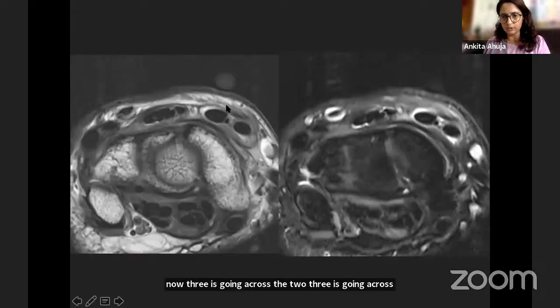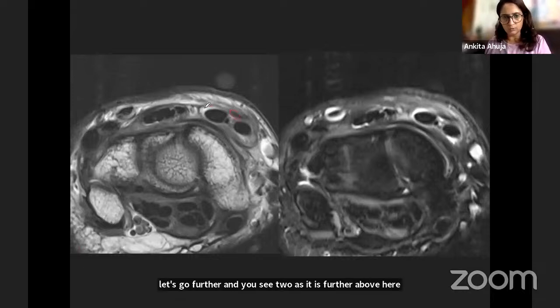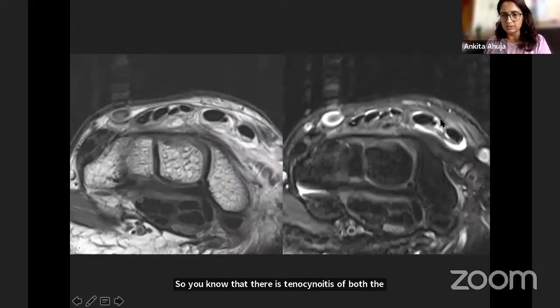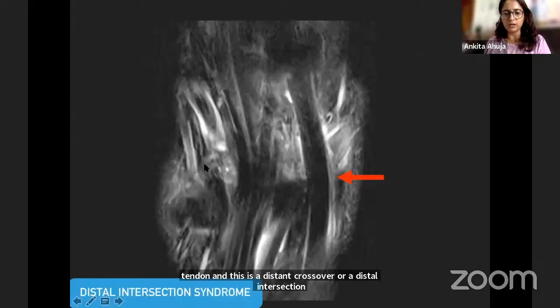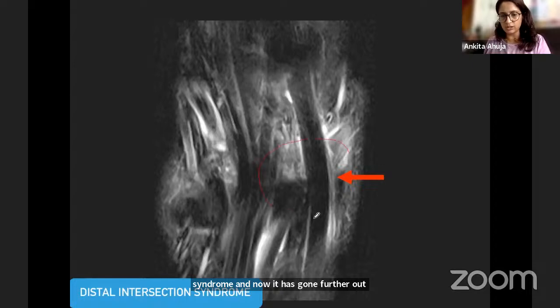But let's go further and you see 2 as it is further above here. So this is your 3 which is crossing over the 2, and the 2 is also inflamed, and you can see the pain marker is exactly at that level. So you know that there is tenosynovitis of both the tendons and this is a distal crossover or a distal intersection syndrome, and now it has gone further out. So on your sagittal and coronal images, again you see inflammation in both the tendons.